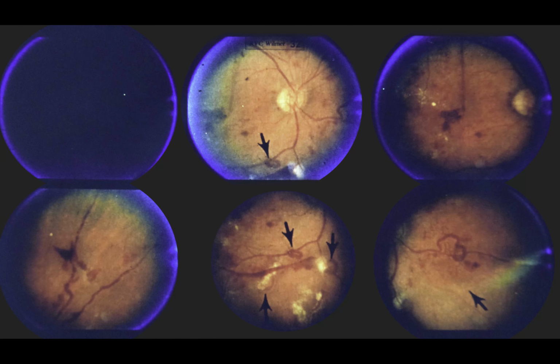Slide 32, retinal neovascularization. This 52-year-old white male pharmacist had lost 20 pounds over 3 months. Sudden loss of vision in the left eye prompted an ophthalmic consultation, at which time severe diabetic retinopathy was discovered. He was not known to be diabetic.